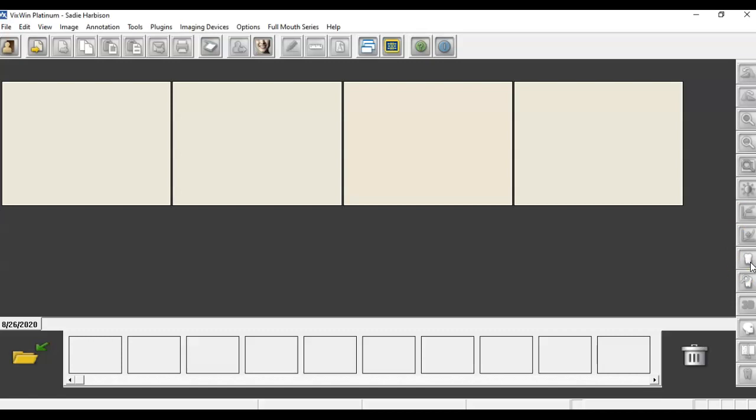You need to get in the habit of, with every single x-ray you take, you'll expose the image. It'll be down here in this bar. You'll click it, drag it up to where it needs to be. Perhaps you'll have to rotate it, and then you optimize it. Every single film. And you can't wait until the whole set is done and then go through and optimize each one.